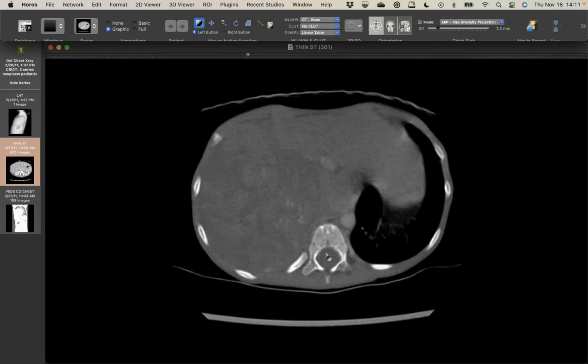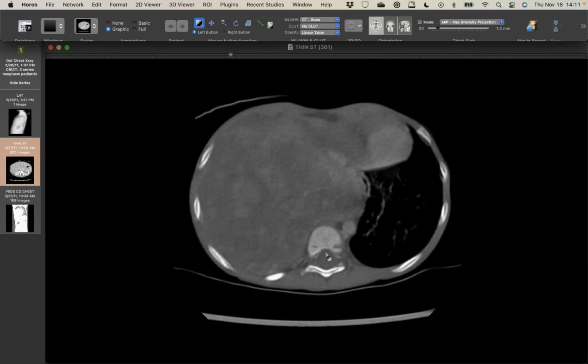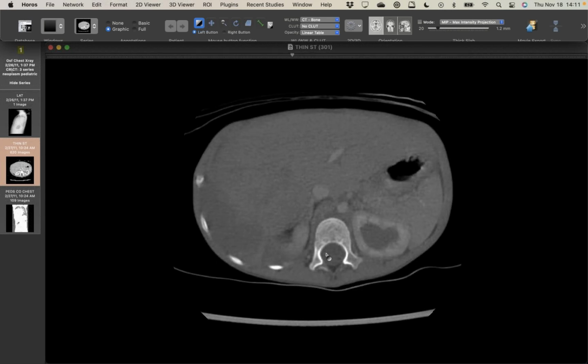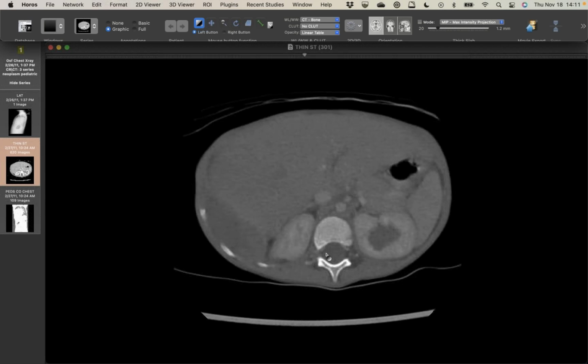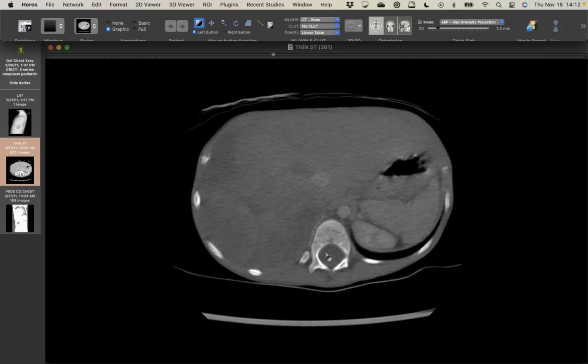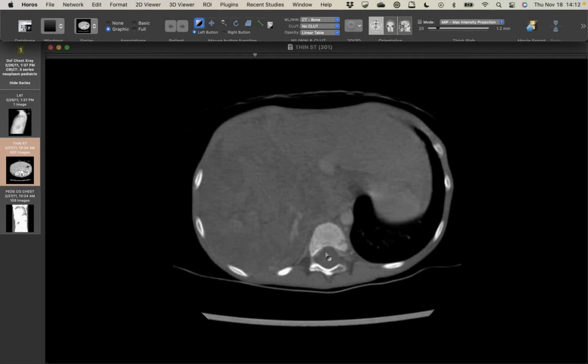The type 1s are mostly cystic and can look a lot like a CPAM. I've never seen one, so I don't know what that looks like, but in my reading about these, the type 3s tend to be the more aggressive ones, but this one responded to therapy. It's an older case, and they can treat with chemotherapy because they are fairly responsive to treatment, but they can metastasize to other sites, predominantly bone in this case.